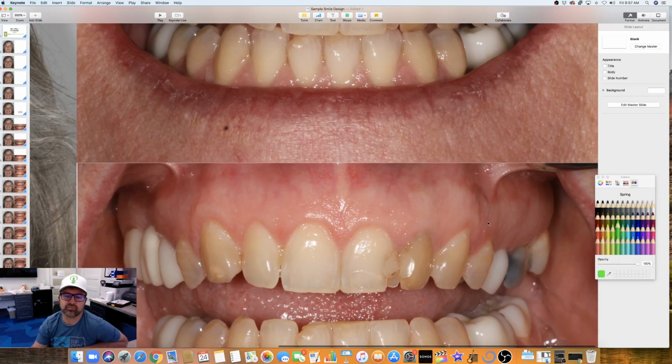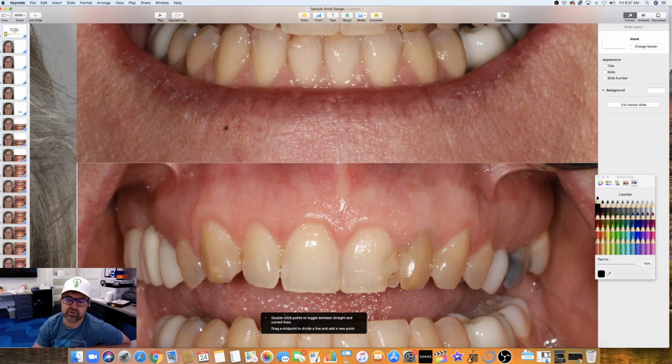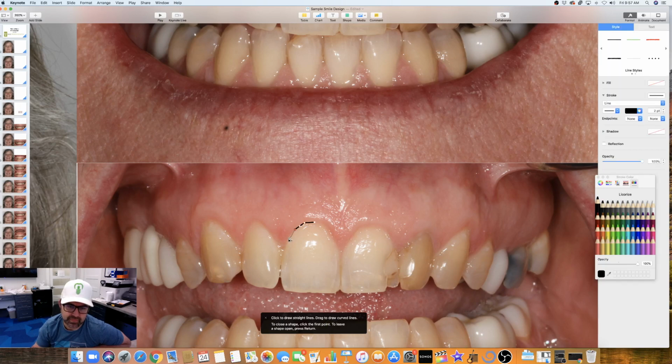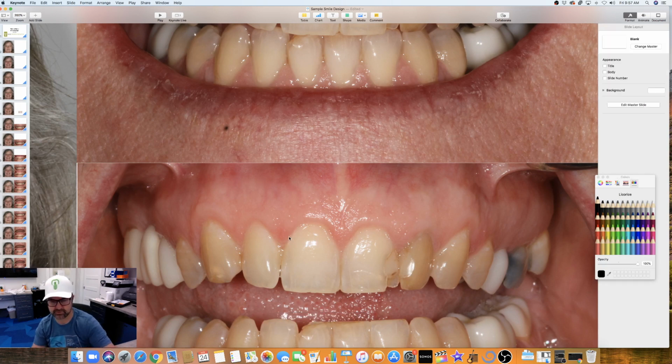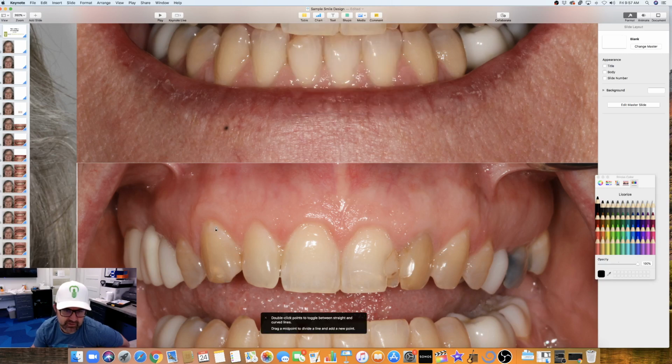And we're going to make the teeth look more ideal in our mind. And again, harmony and symmetry I think are most important. So you can actually take a tooth you think looks the best. So let's just take this one. This tooth looks pretty good. However, let's delete that just for a second. You'll notice something about it. If we're going to make it ideal, this lateral is a little bit longer than both of these. So we're going to actually see if we can lengthen just a little bit.